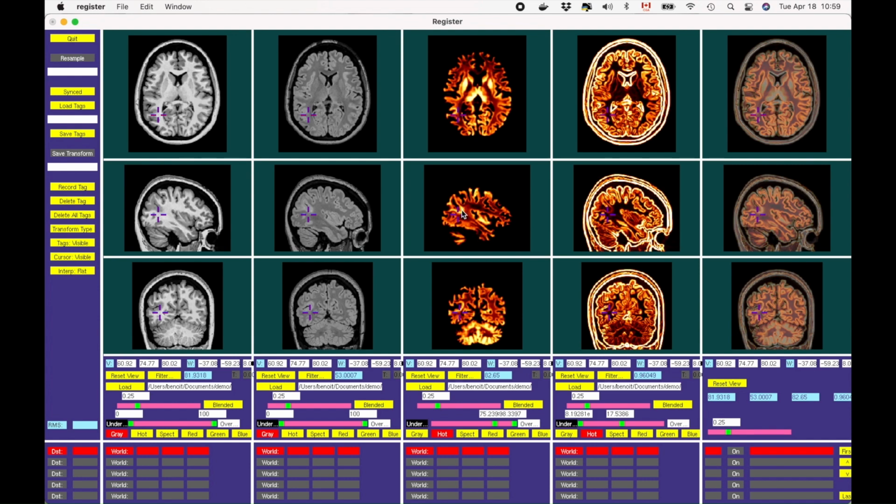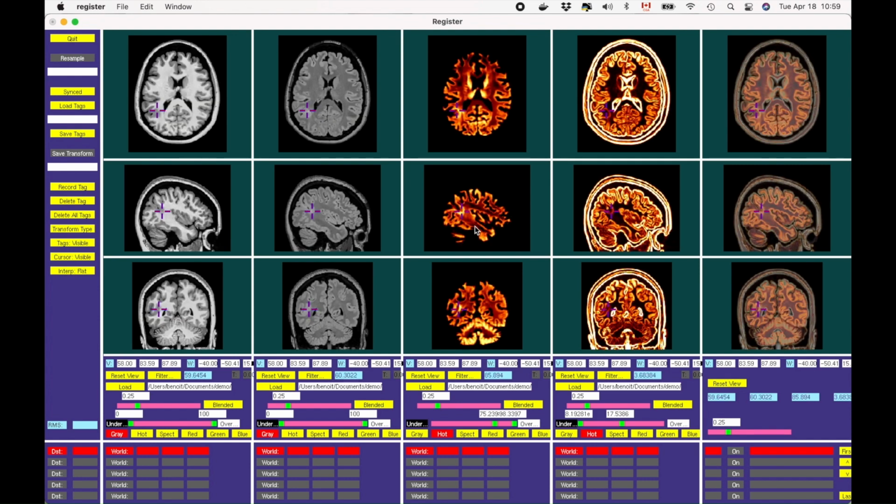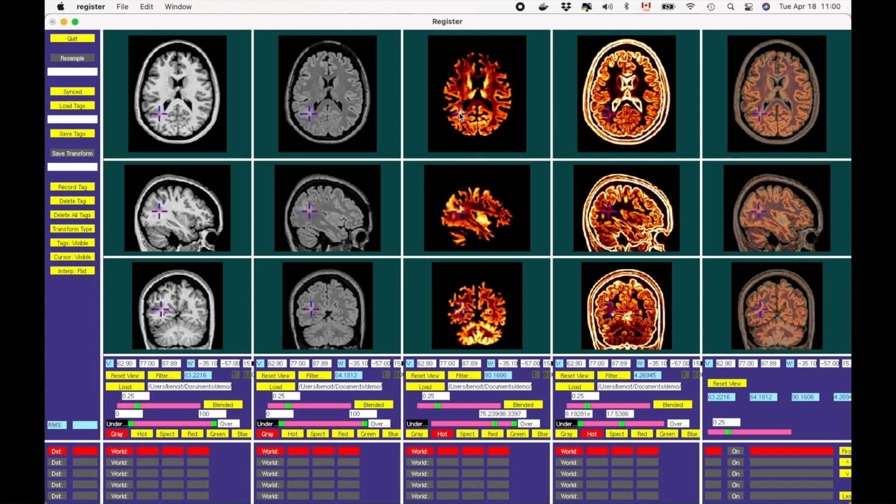And if we go check on the sagittal view, it looks like it confirms our finding. So remember, when you see a finding in one view, whether it is axial, sagittal, or coronal, you need to confirm this finding in all other views.